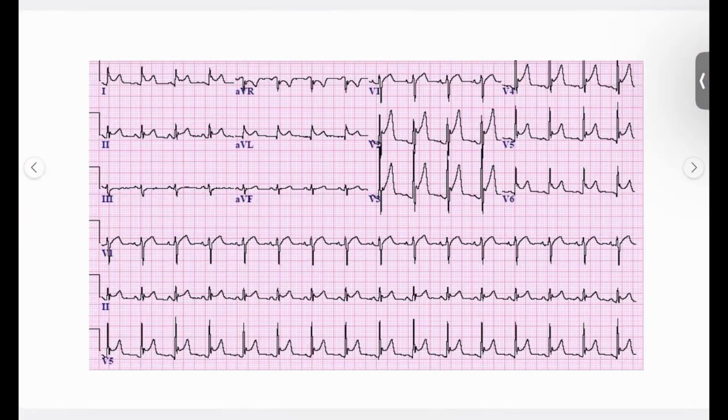Next, moving on to the ECG. Here you can see the ST elevation is seen, and also in lead 2 in this patient. And here also the diffuse ST elevation is seen. V5 is also ST elevation, and also here you can see V3, V2, V1, V5, V6. All the leads are elevated. What could be the diagnosis of this patient? Not all the arteries are going to block, and if all the arteries block, obviously the patient is going to have ventricular tachycardia or ventricular fibrillation, but still the patient is having all the elevations. What could be the cause of this condition?